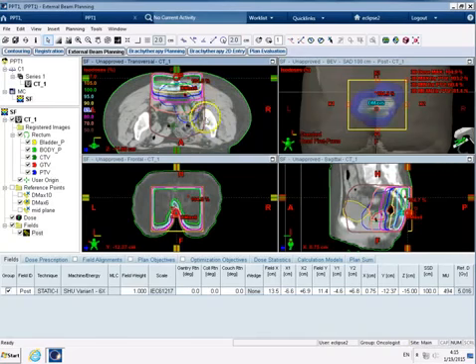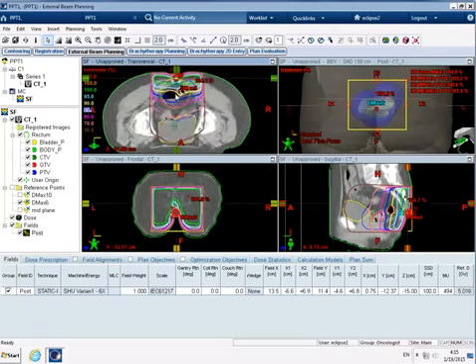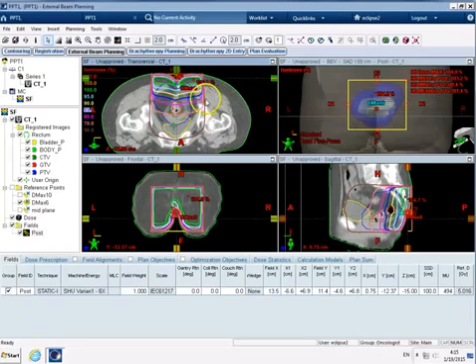So something like this. Okay, so clearly this isn't very good, is it? So here we're irradiating tissue here that we don't need to, and lower down we're irradiating tissue here that we don't need to. So that equates to that portion there and that portion there. So the thing that we can use to shape the field better is our MLC, our multi-leaf collimators, and all modern Linacs have MLCs on them. So that's what we're going to do now.